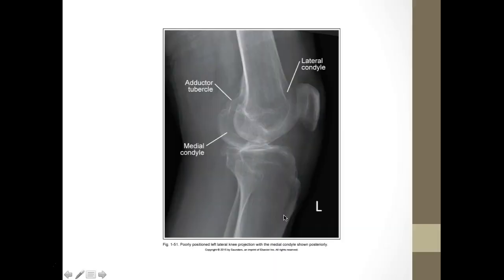So when looking at this knee, you can see here that we are rotated. You're going to determine, okay, how far off are these two? Let's just pick a number. Let's just say it's about 1 inch off. You're going to want to rotate the knee half an inch because both parts move. So the medial and the lateral condyle are going to move. So you're going to go half the distance in rotating the knee, or the body part, in the correct way, because both parts moved.